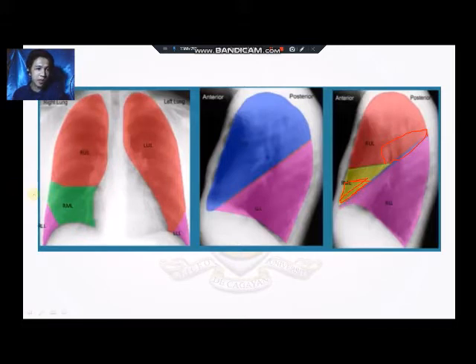Okay, and then of course kung mag AP ta, then naa siya diri rapit nga portion. Then kung inferior lobe ang affected sa atong right lung, then diri siya rapit nga portion. And then makita pa nato siya nga naa siya diri rapit nga area. Okay, and sometimes mo appear pa gid na siya diri, kay iyahang orientation na siya sa likod and also inferior sa atong middle lobe.